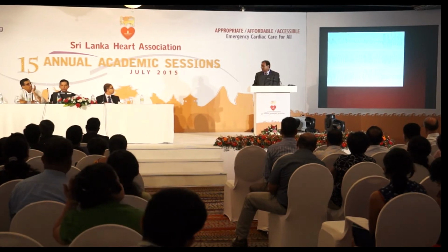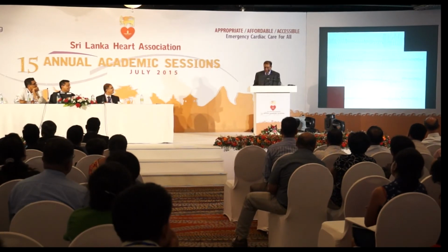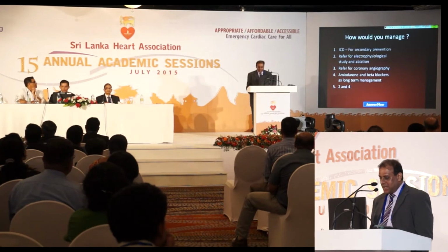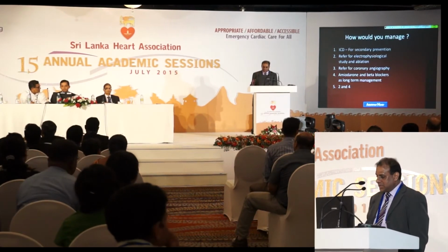The emergency is due to the fact that if you don't do something quickly, it can deteriorate into fast antegrade atrial fibrillation followed by ventricular fibrillation. This is actually a patient. Luckily, this happened in the EP lab, so we basically cardiovert and you go on ablating. Right? So how would you manage the patient? That's our next question. Now we have the emergency, we got the diagnosis. Now what's the next step?